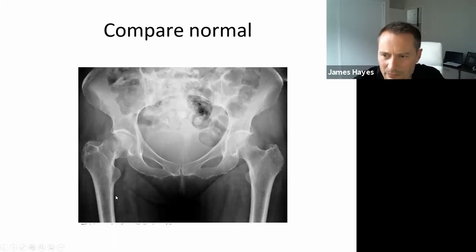Now, if this was a better image, you'd be able to see a huge break along here in the trabecular pattern, okay? And this would have been a lovely one to zoom in on, because you can just about see the trabecular pattern here. I sound very excited over a few holes like Swiss cheese. And along here you can see trabecular pattern down here quite normally, and you can see trabecular pattern along here, and along here it would shift, okay?